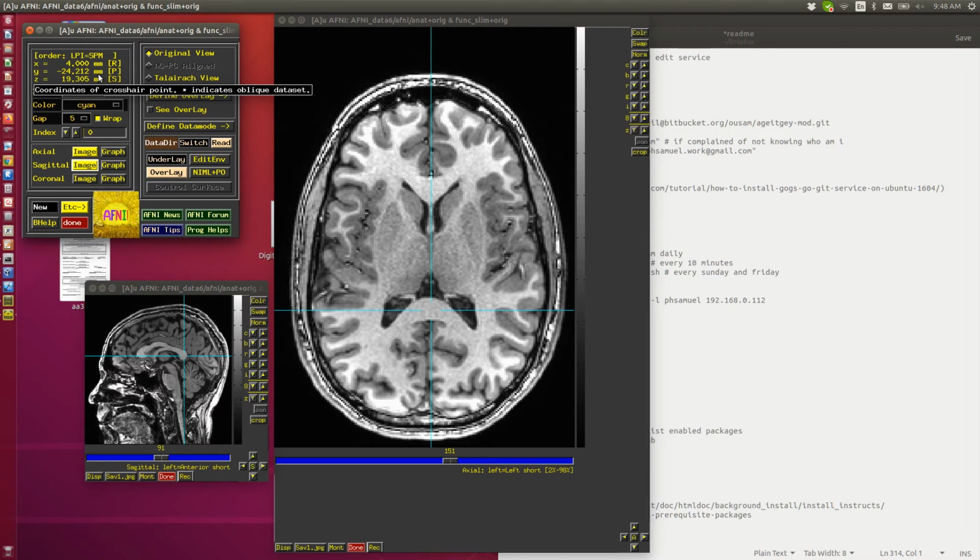The x in the neurological coordinates, which is what SPM popularized, runs from left to right, left being negative, right being positive, and so on. So basically that coordinate system is rotated 180 degrees. If you're going to report in papers, almost always you report in this coordinate system, and you can do that easily because you can switch the coordinates around in AFNI. Inside, AFNI works in DICOM coordinates.